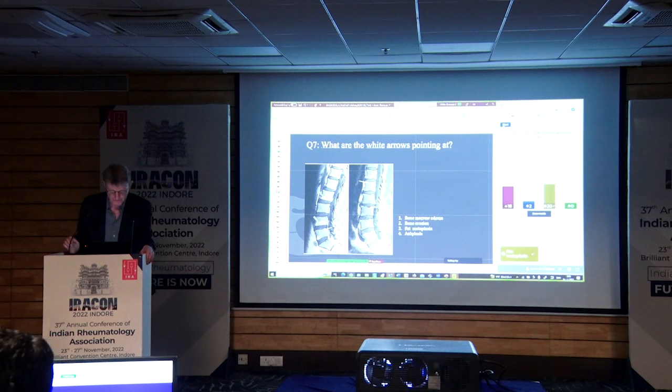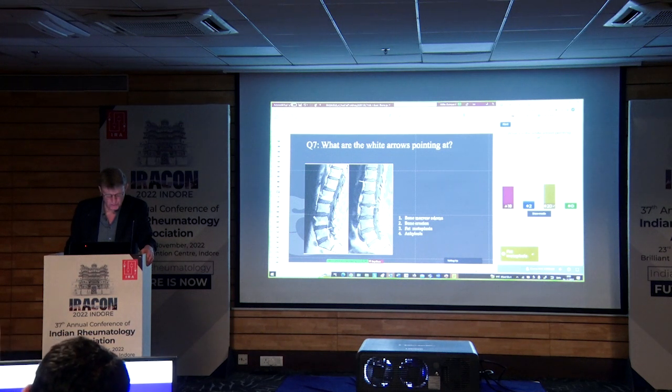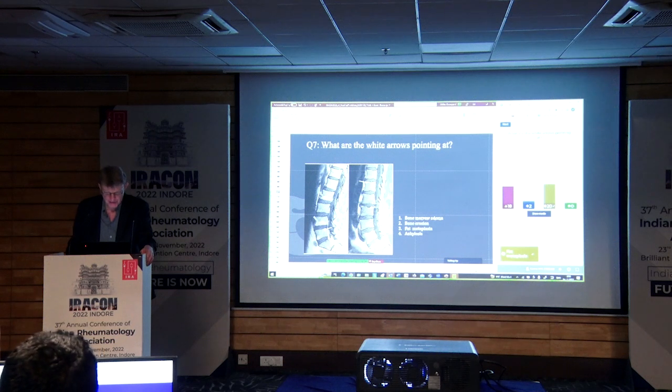Okay, right. So the first thing you should always consider is which sequence are we looking at. The water inside the spinal canal here would be bright on a STIR sequence, and thereby also bone marrow edema would be bright there. And on T1 it would be opposite. There water is dark and fat is bright.